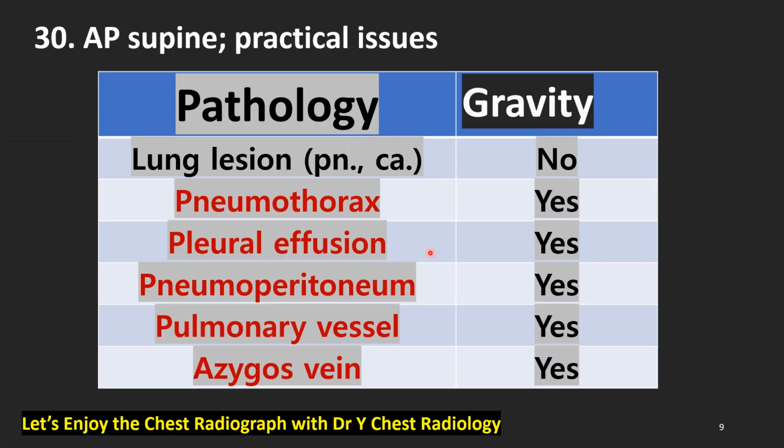Let's review the effect of gravity direction on real clinical, practical issues. True pulmonary lesions such as pneumonia and cancer have no real impact according to the gravity direction.